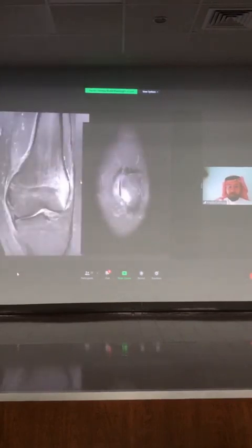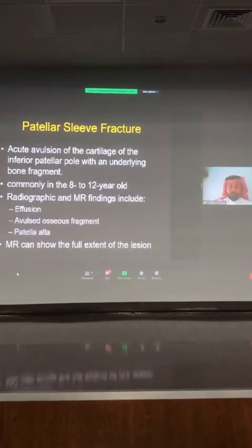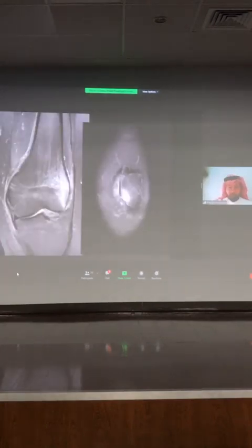So in the same patient, you can see the classic bone marrow contusion pattern involving the lateral femoral condyle and the medial aspect of the patella. If I see this, it's a transient lateral patellar dislocation. Most likely there's a shallow trochlear groove, the medial patellofemoral ligament is disrupted, and this patient usually will be treated by our colleagues in orthopedics.